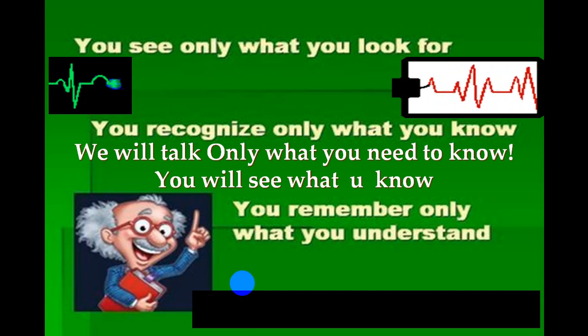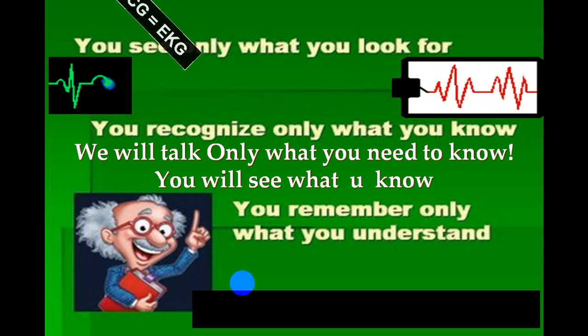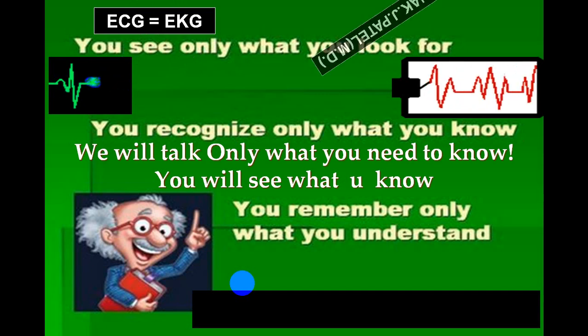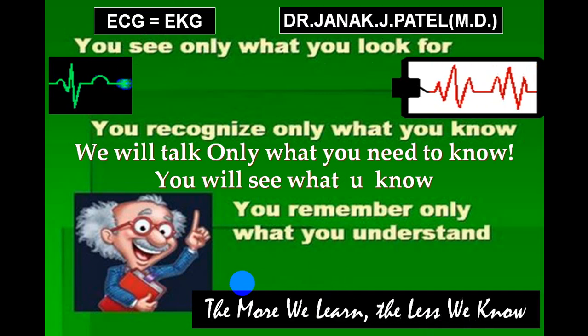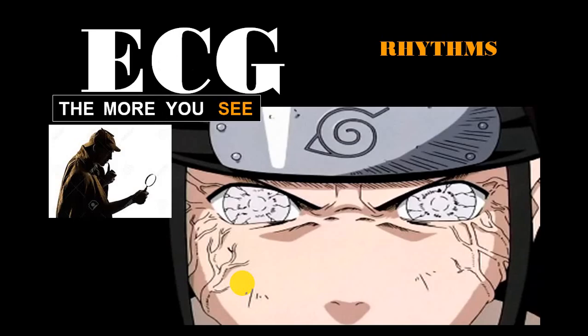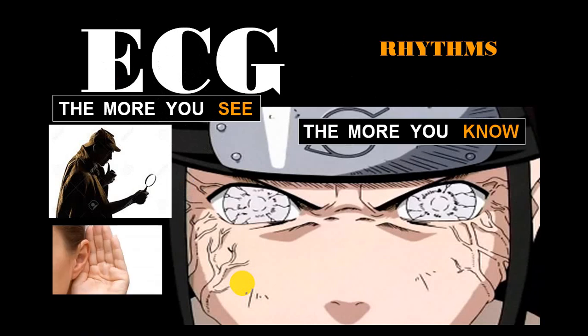Again repeating, you can see only what you look for, you will recognize only what you know, and you will remember what you understand. So I'll try to make it as simple as possible so that you can understand very nicely and you can remember for a lifetime. So we'll be starting with a topic we call ECG rhythm. Again, see as much ECG as possible and listen to the person who is explaining as much as possible, and then you will know more and more.